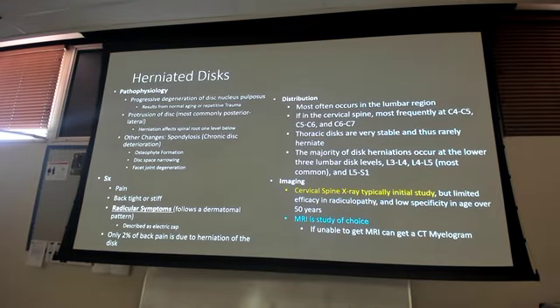But herniated discs. Okay? Spine, cervical, or lumbar, whatever it is, the initial study, always for all this stuff, because what if it's not a herniated disc? What if there's a bony abnormality, like that last one where it had the fracture, it had something sitting in the spinal canal area? MRI is your study of choice. Why? Because we haven't been able to see the discs unless we do an MRI. We can't see the CSF in the spinal cord without doing the MRI. And you'll see what these abnormalities look like on MRI. This is the one MRI I would expect you guys to be able to dictate, read, and find the abnormality. And you'll see why here in a second.